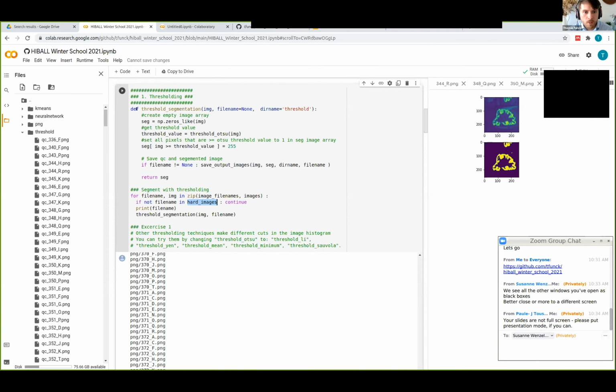So you guys can try that right now. For those who have never programmed or are a bit intimidated by Python, I'm going to go through it myself. I won't talk so I don't distract people who are fiddling with the code themselves. You can follow along with what I'm doing if you want to. We'll do this for a few minutes.